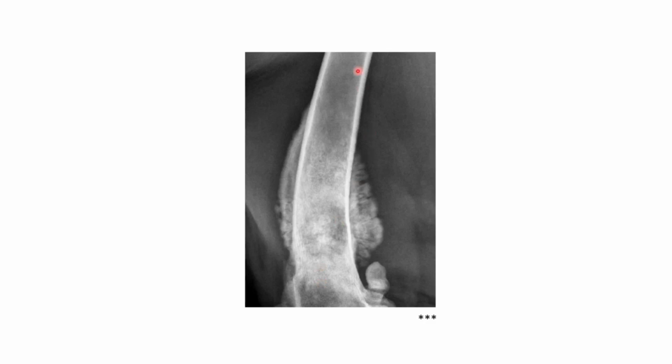If we look at the level of the mid-diaphysis, you can think, is this normal bone here? At what point does the normal bone become abnormal bone? It looks like there's some permeative lysis affecting the diaphysis here, but where do we get from normal to abnormal? It's really impossible to tell. So this lesion has a very long, indistinct zone of transition, and that's often associated with aggressive bone disease.